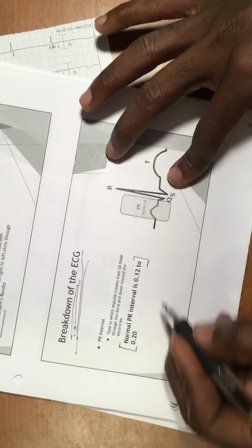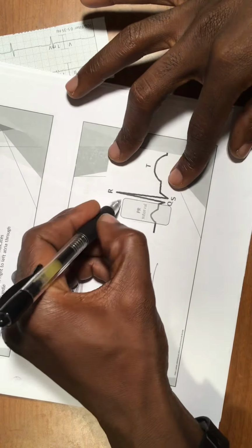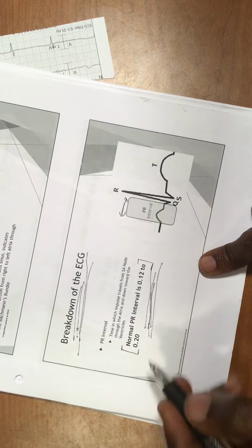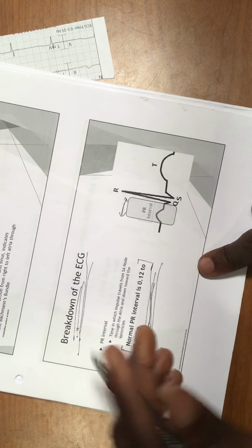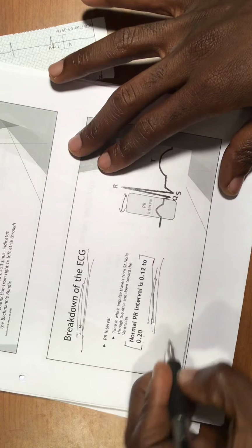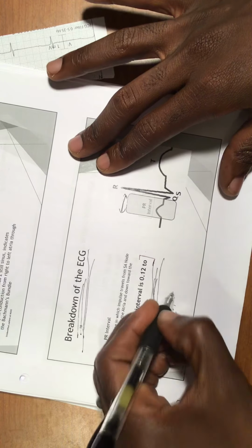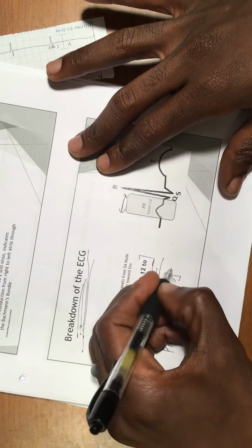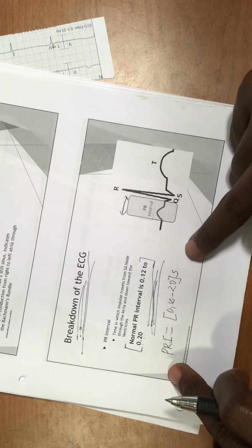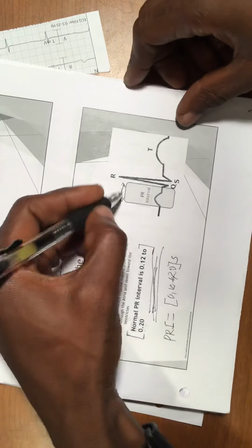Here again, you can see it with me. They tell you this is very, very important. I put it here, and this is where they show you the PR interval. As I was showing you, the PR interval should be around 0.12 to 0.20 seconds. More than that, you can tell that you have a pathology going on. So remember that. The PR interval is this. Always put that in your mind, guys: the PR interval should be around 0.12 to 0.20. This is very, very important. This is the PR interval.